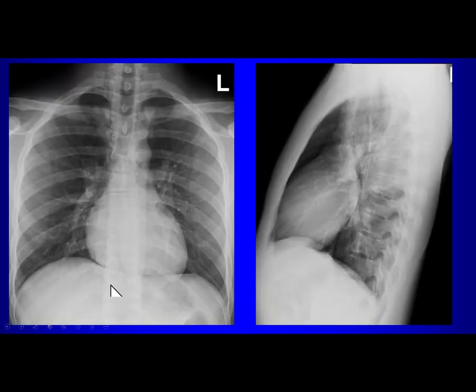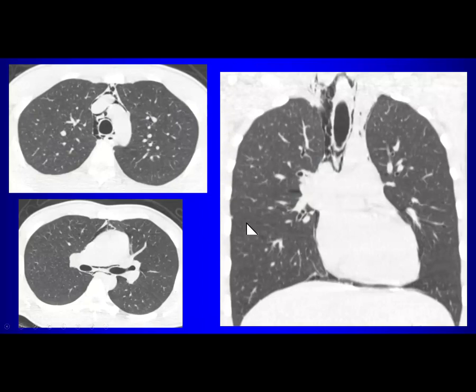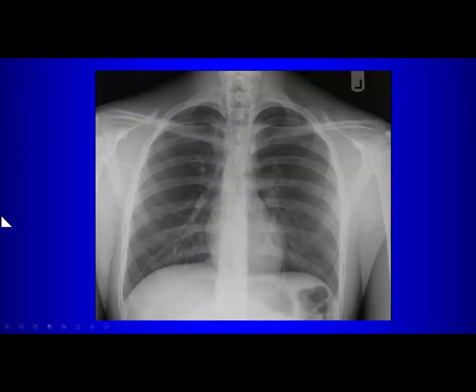Okay. And then here's the lateral view showing you some air along the mediastinum. This case is fairly subtle for pneumomediastinum. If you think about it, it's an easy diagnosis with CT. We just look for air tracking around the mediastinal fascial planes, okay? Then the air going up into the neck accounts for the crepitus that patients often have on physical examination when they have pneumomediastinum.